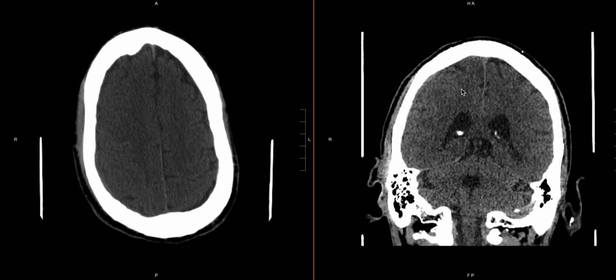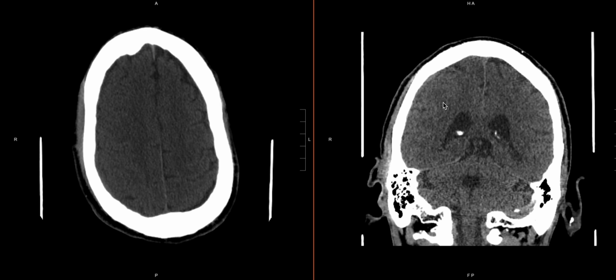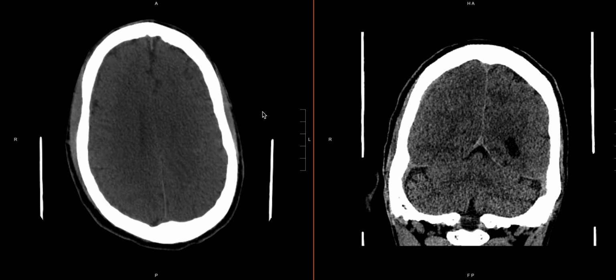patient presented with trauma. So this is an easy to miss subdural, and sometimes it's literally that subtle, and that's all you get, and you have to make the finding. So again, you want a window so that you can see this. If I go back to a standard brain window, you're never going to pick that up. And then you want to be able to also look at your coronals here to help you make the finding, because it's going to be incredibly difficult to pick this up on the axial confidently.